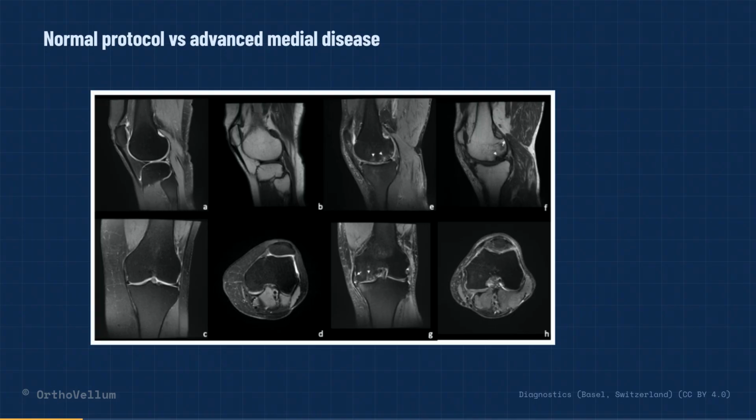The healthy knee: smooth, uniformly thick cartilage, the 2 to 4 millimeter layer intact. Advanced medial compartment disease: irregular thinning and full thickness loss, marrow lesions, meniscal extrusion, osteophytes. On fluid-sensitive sequences, higher-grade lesions show joint fluid tracking into a deeper cartilage defect, with subchondral edema or cysts in the most advanced grades. And carry the protocol's honesty with you.